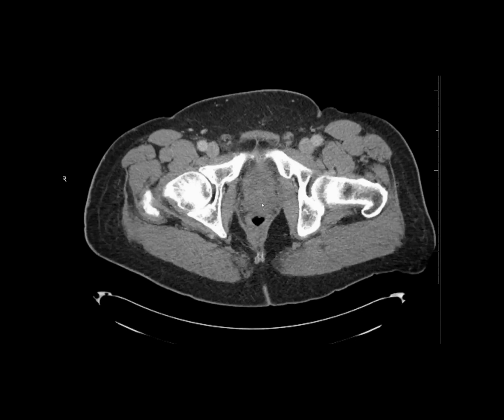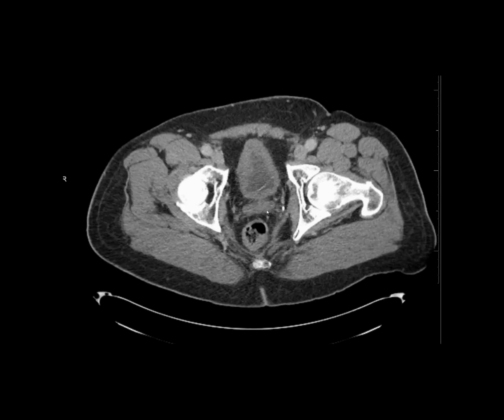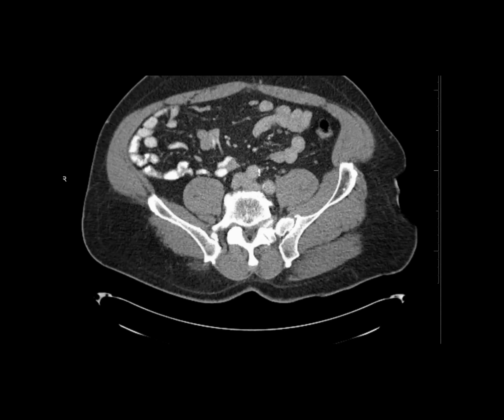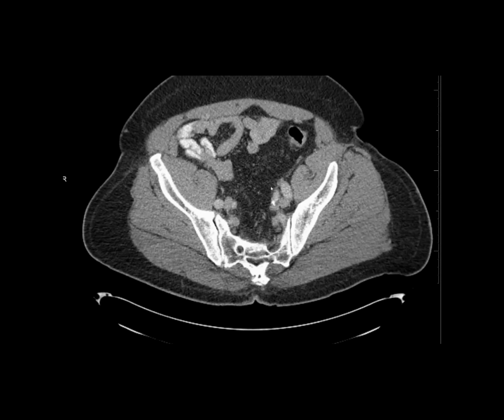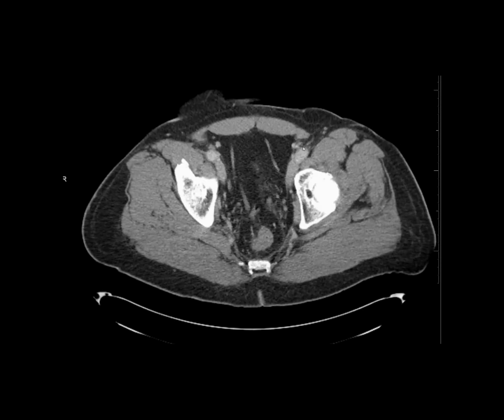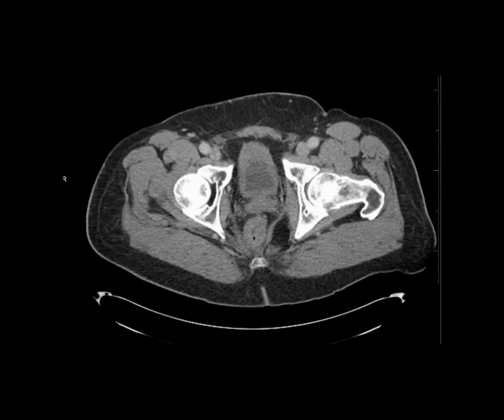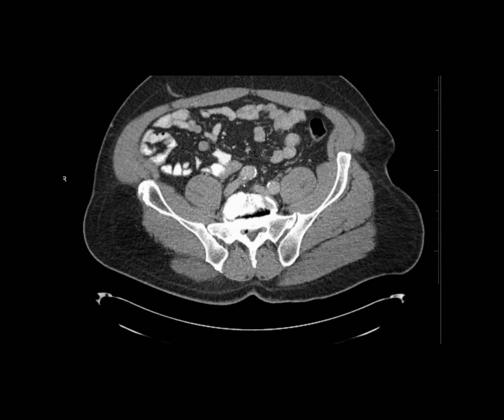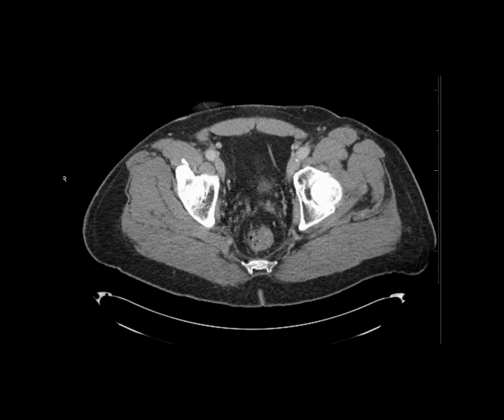When looking here, I try to find anything related to the prostate that looks abnormal. Again, my hint of following the pelvic vasculature is really helpful in this. And again, looking for common iliac disease, which is a non-regional node in this case, following the external iliac, I don't see anything here along the medial margin. We'll do the same on this side as we go along. I don't see any abnormal lymph nodes that measure greater than 8.